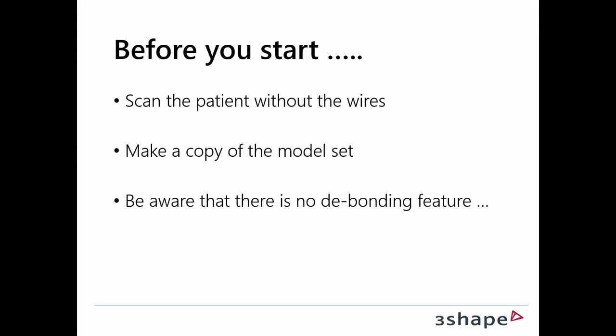And thirdly, be aware there's actually no debonding feature in the ortho system, and you may think this is strange, having a video about a feature that doesn't exist, but actually we're using an existing feature in the ortho system for doing debonding, and Rikke will show you just in a minute how that works.